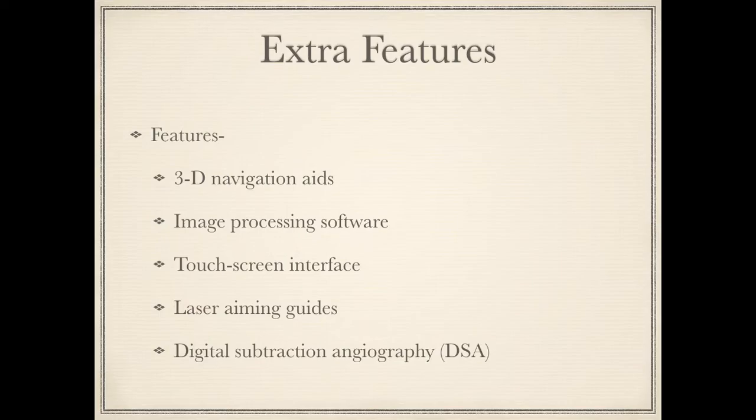I find these really useful if you are trying to identify the point for needle insertion, and they can guide you a lot with this. Digital subtraction angiography is really useful when you want to avoid intravascular injections such as cervical nerve root blocks. So when you want to be absolutely sure that it's not intravascular, this is something which can help you more than other modalities.